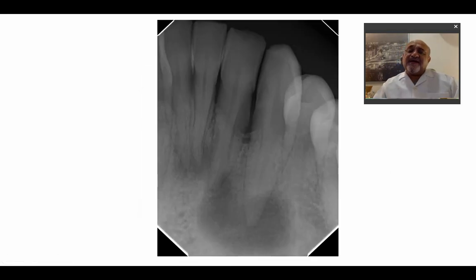Now we are in the canine area. In the canine area, you can see central, lateral, and this is canine, first premolar, and second premolar. Here there is nothing specific, except sometimes, of course, pathology that is related to these teeth. This is not something normal. You might expect to see the mental fossa. You might expect to see the mental ridge present in this area. There is no other radiographic entity that is specific to this area, unlike the images that we have seen in the central incisors.